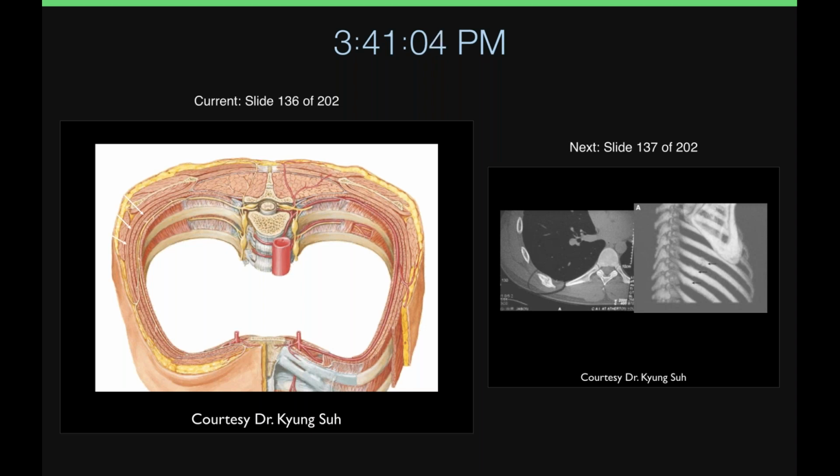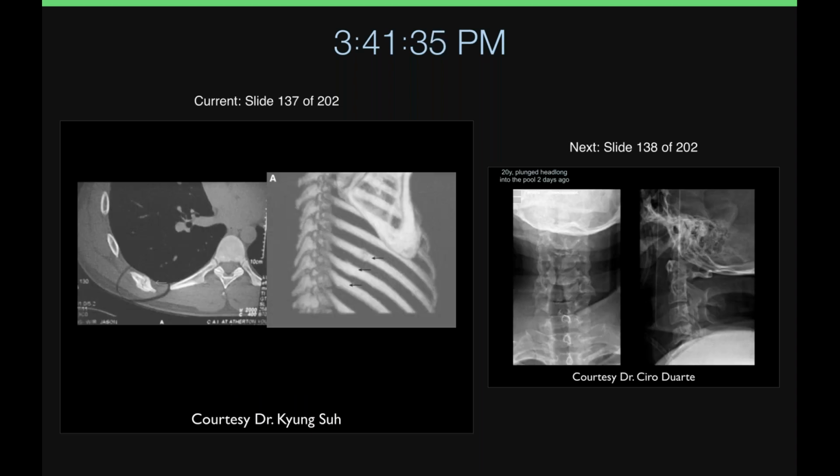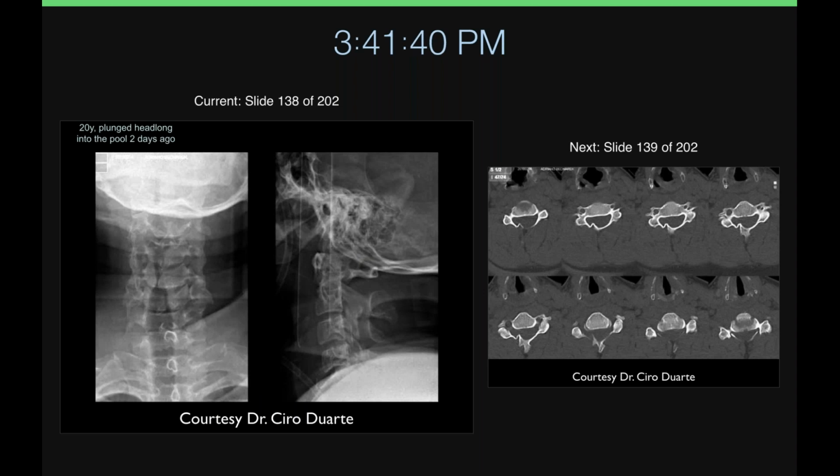If the concern is just a rib fracture in a non-athlete, then you just usually treat it conservatively and you don't need any imaging. Sometimes people get plain films because they think it's cheap, but the plain films are often negative. But in an athlete where you need to make the diagnosis to decide how long they're going to be out of playing and so forth, then we typically get an MR. Usually it's more of a muscle tear rather than a stress fracture, but occasionally it's a stress fracture. Okay. And here are just some typical fractures that have healed.